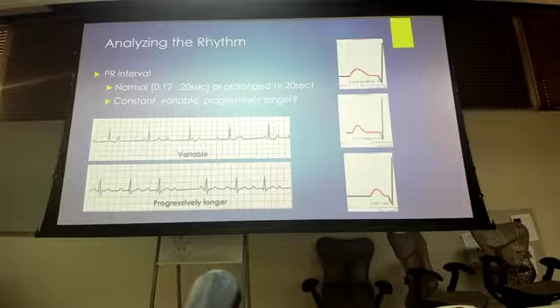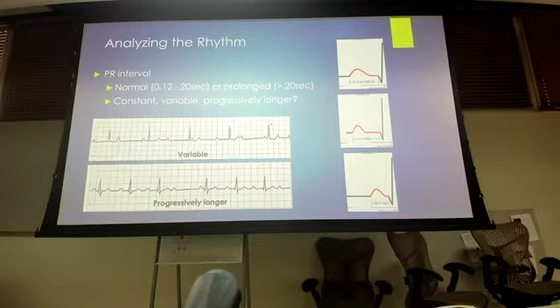So for this, we have our P here, but if we measure these QRS complexes out here to here to here to here, if you look at those, don't they look pretty regularly spaced, the QRS complexes? So that tells you it's not a dropped QRS complex. It tells you the problem is with the atrium, the problem is with the P wave. So very good question.